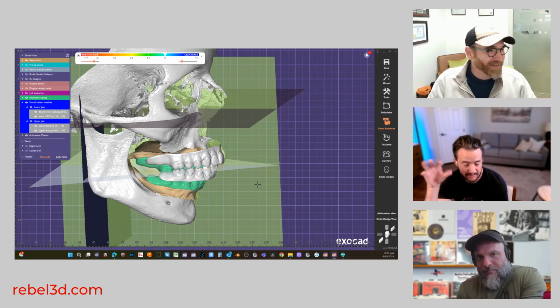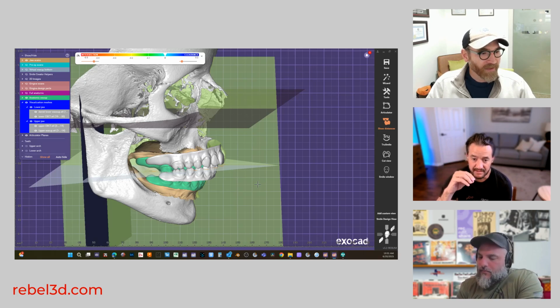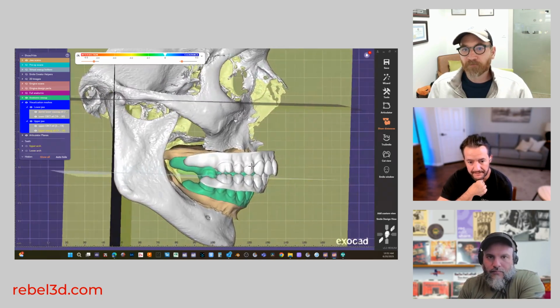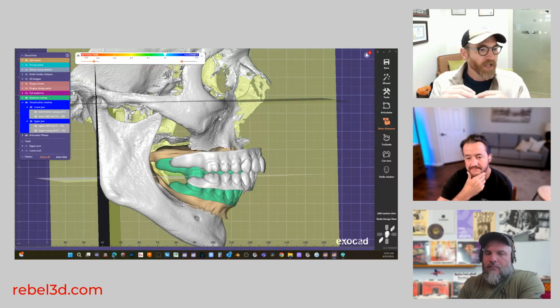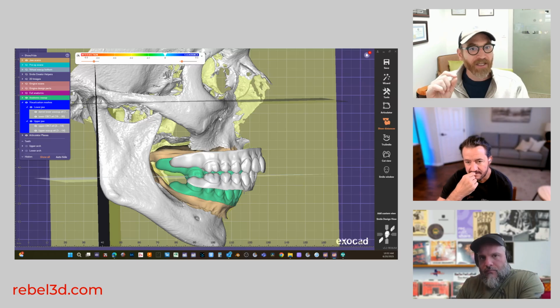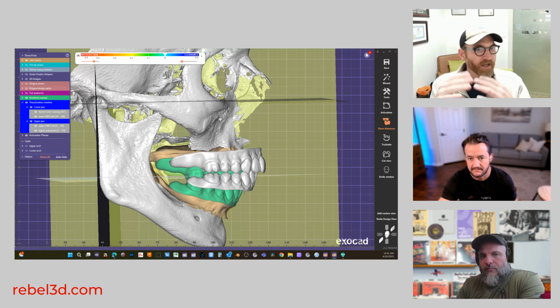So, Dr. Sven, what problems could occur clinically and impact the patient if you were to proceed with treating this patient with Daniel's mounting? Yeah. So one thing we will see here, let's say in this scenario we're opening the bite, and it's too close. Her facial third is smashed up down here. Also, closest speaking space: when you say Mississippi 66, we're looking for about 1 millimeter of space in the premolars. That's another indication of whether this patient is too open or too closed.